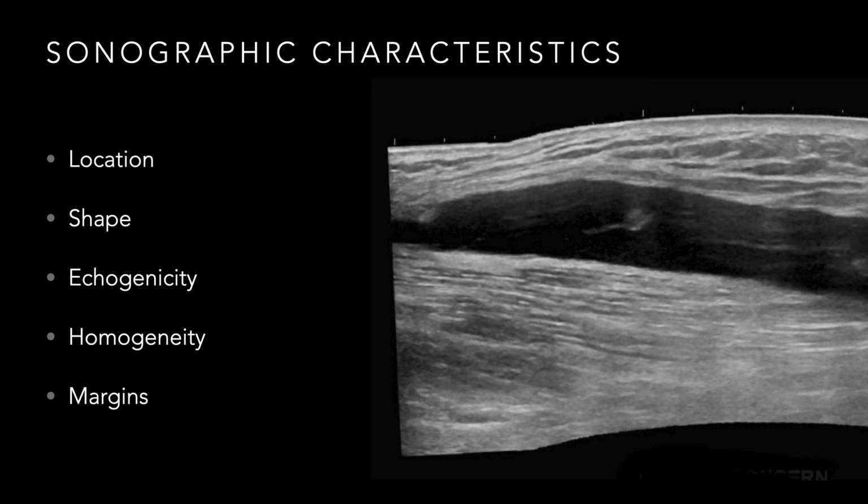So what about shape, right? They found that there could be multiple shapes to these things, but most of them had this fusiform, elongated shape. That being said, some could be more flat and some could have more of a lobular appearance, but most of them had this fusiform type appearance. And the ones that I've seen have been kind of this, right?